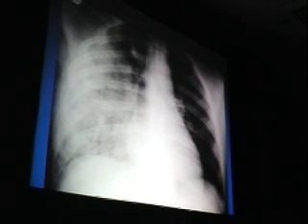At this point, if it was an acute process, I would not necessarily be thinking about some of the other cellular things like bronchoalveolar cell carcinoma, organizing pneumonia, eosinophilic pneumonia, and that sort of thing. On the other hand, if the patient was presenting more with a chronic insidious presentation, say a radiograph a few months ago showing a smaller opacity, now it's larger over a number of months, then I would be thinking about things like maybe chronic infections, tuberculosis, fungal pneumonia, blastomycosis perhaps.